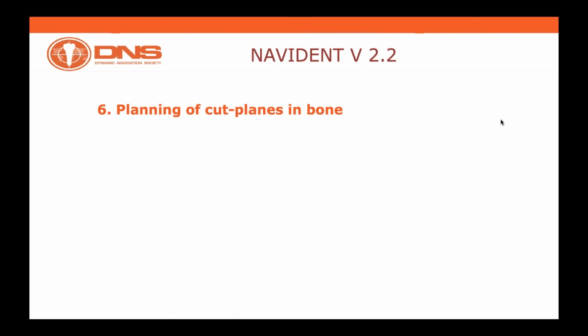Of course, as we can see from Dr. Bouget's question, this is a very compelling statement, and we are, of course, in the position to introduce with Navident an option which didn't exist before, which is adding multiple STL files, being capable to match those STL files together by using some references.